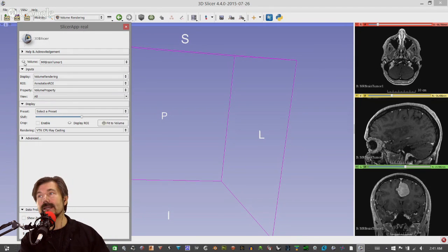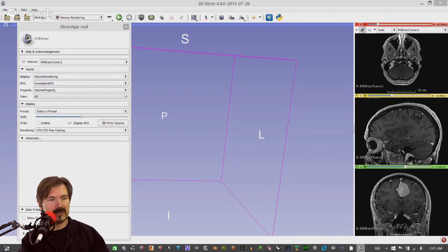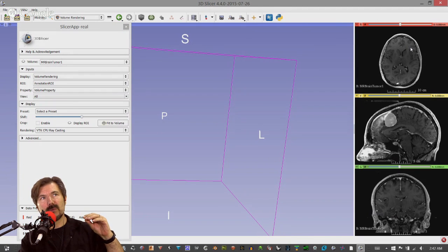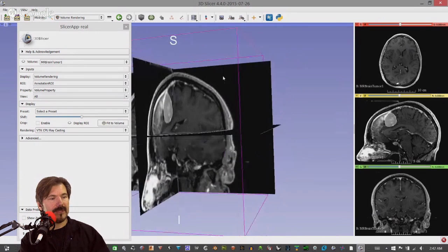Now, if you notice, there's an eye here. Now, let me do one other thing so you can see what people have worked with in the past and what you can use now. First, you see, I'm moving this little icon here, and what this allows me to do is link all the three views together, which is great if you want to do the same thing through each of them. I am going to select this, which will center the region of interest location right in the middle. And then I'm going to turn on the three views.